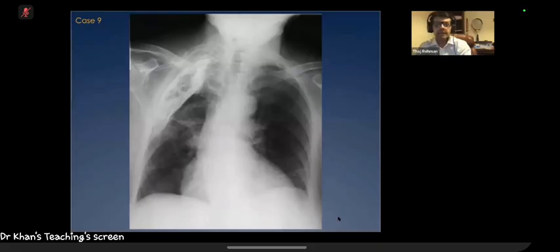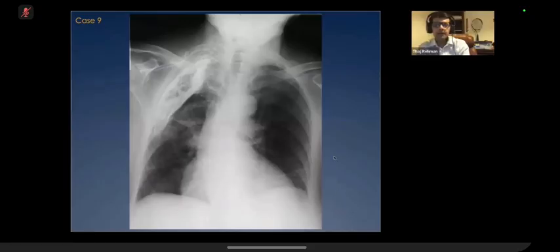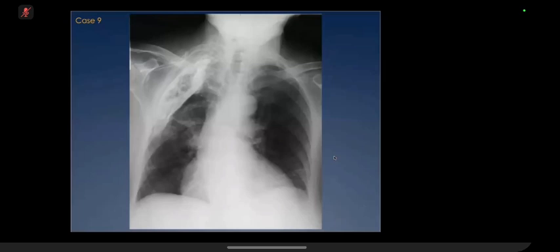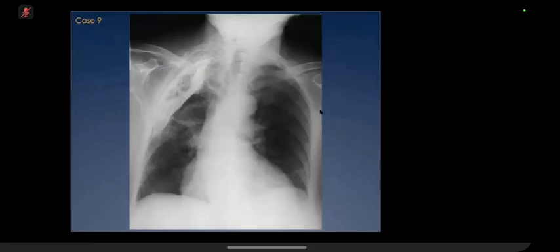It's a calcification in the pleura, apical pleura. So calcified pleural plaque. Is this how pleural plaques appear? It's not the typical appearance, but I agree. That's because it's not a pleural plaque. Pleural plaques have a typical appearance of leafy, edgy calcium with central lucency. This is a heavy, dense calcification in the pleural space, and you can call this a calcified fibrothorax. That's the term you can use for this.